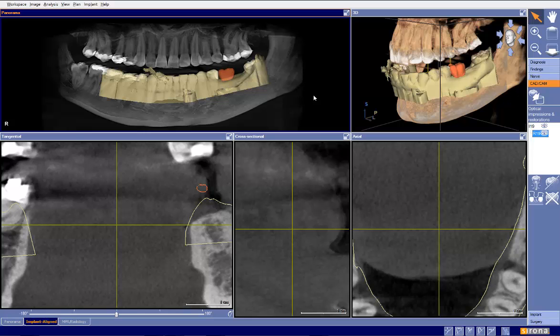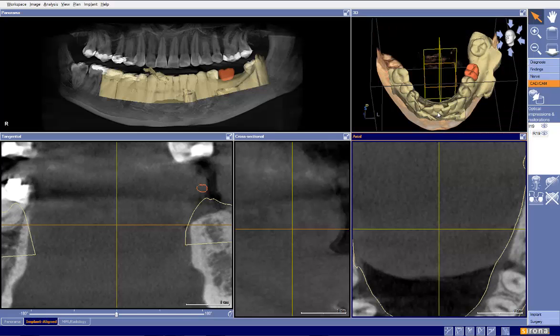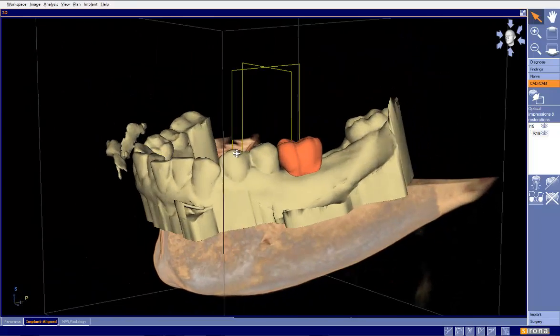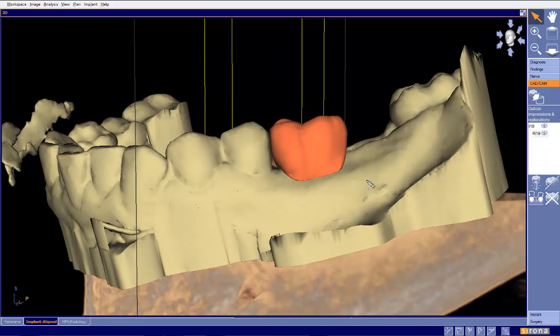Now, one of the nice things about having good CEREC data is that I like to check out the quality of the CEREC data. So we'll go ahead and take a closer look here. What I like to do, and one of the things that we talk about in our courses, is fine-tuning our CEREC design. In looking at this one, the one area that I would critique in the CEREC design would be our gingival design. It would probably be more along this line right here. Here we can see that it's been drawn a little bit long. It doesn't matter that much, but it's not exact, and I definitely like to keep an eye on these things.